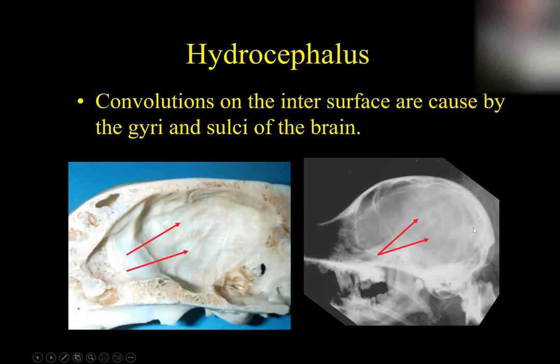That shelf of bone is called the osseous tentorium or the tentorium cerebelli, which, if you take that word apart, means a tent, tentorium, over the cerebellum. So it is a bony tent sitting on top of the cerebellum. Typically you can see that on radiographs. There it is. It's this little protuberance of bone that you can see right in there in the base of the skull.